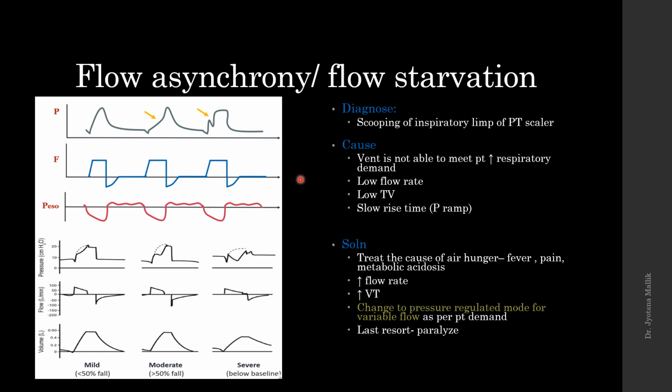So if there is asynchrony, the cause of asynchrony is basically when the ventilator is not able to meet the patient flow demand. It could be because of a low tidal volume, or a low flow rate, or maybe a slow rise because of that.